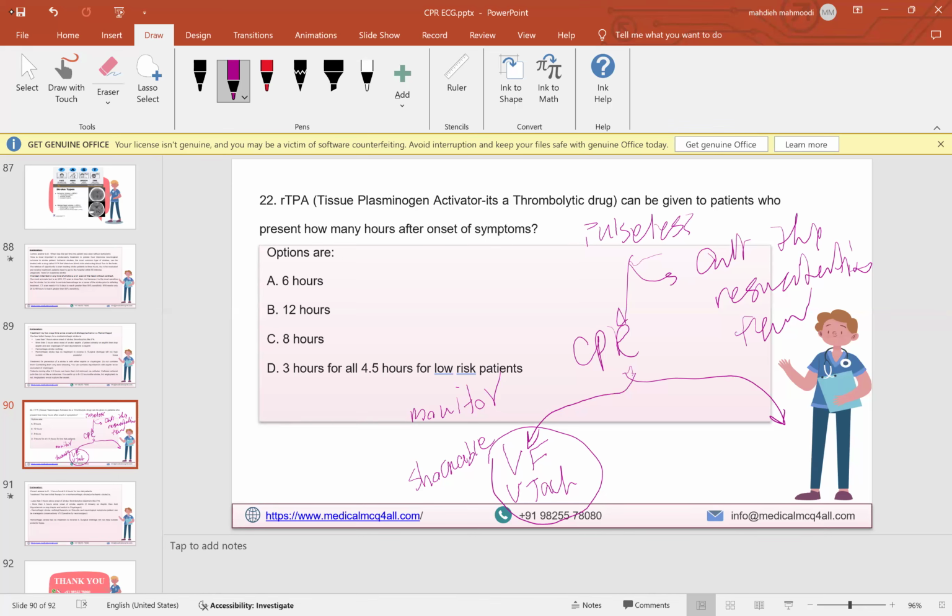Anything else you see, and I'm telling you, you might see anything. Your patient is pulseless, you might see anything. You might see a flat line. This is called asystole. Or something that we call pulseless electrical activity, which means there is electrical activity, but there is no pulse. Example, it could show a normal sinus rhythm.